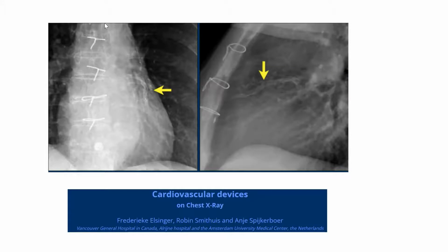Anybody? Also, I think coronary calcification also. Coronary calcification, or?